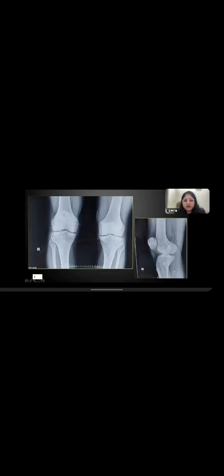Whatever you see and whatever you feel is the diagnosis, you can type in the chat box. Yeah. Chondroblastoma, GCT, patella. Okay, I got a few. I'll move the chat box to the side a little. Right. Good, good. Very good. So if four, five people keep answering, it will keep me going. Yes. So the first important good thing is that you have picked up that the lesion is in the patella. So one step is done.